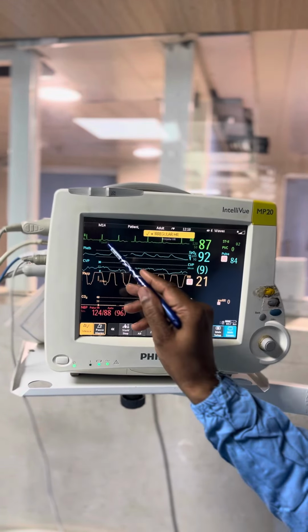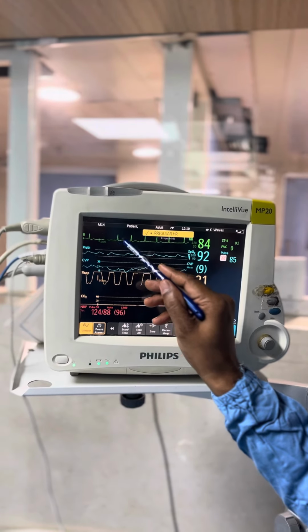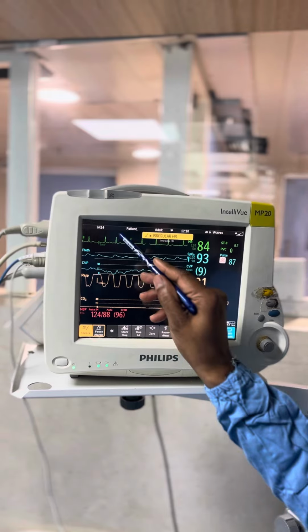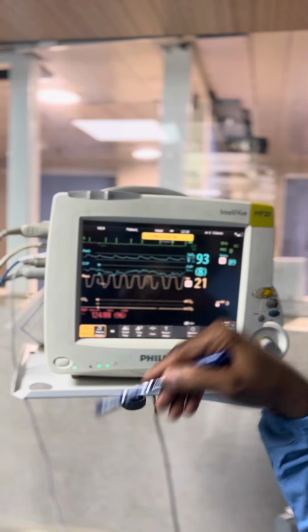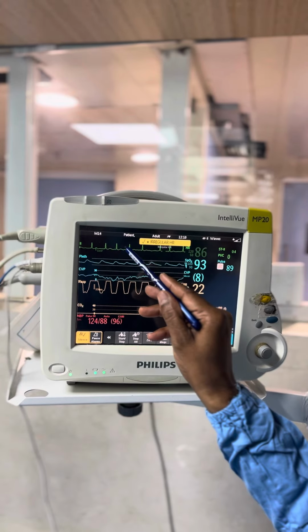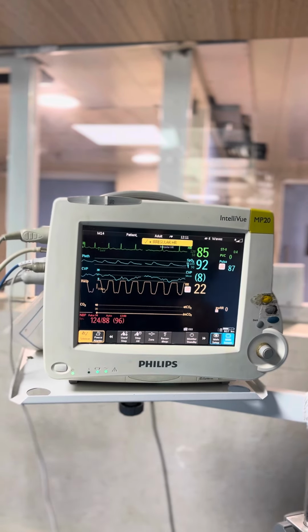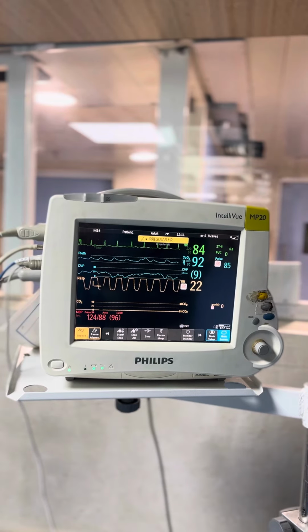What you see over here is a T wave only. There is absence of P wave. Preceding the QRS wave, there is no P wave. So the absence of P wave and irregular RR interval, these are two characteristics of atrial fibrillation. What is the third component?